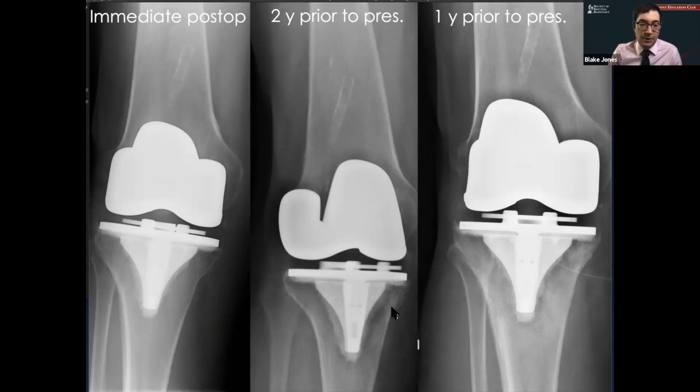On that 2-year post-op radiograph, it definitely represented a change from the immediate post-op images. And probably the patient, if this was really osteosarcoma, should have started to have symptoms by then and would have gone on to cross-sectional imaging, and we probably would have detected it at that stage. But with loosening, sometimes you don't necessarily have symptoms when you have lucency on the radiograph, in which case we wouldn't necessarily go on to cross-sectional imaging.